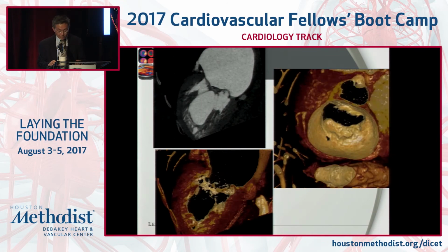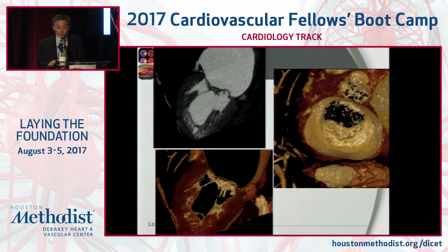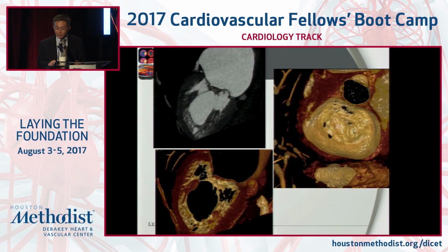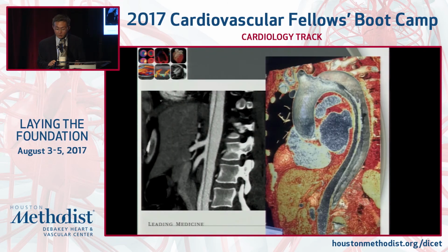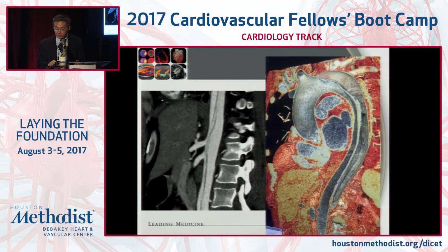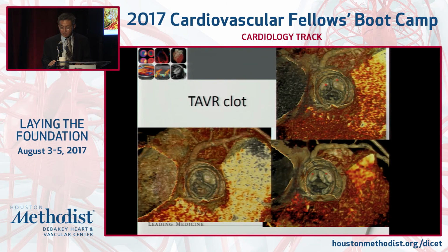It allows you to do 4D imaging, essentially 3D rendered images resolved in time, like this case with a patient with, I'm sorry, let me go back, a patient with mitral valve, in this case a patient with aortic dissection. But the most exciting thing about cardiac CT is the non-coronary application. I'm going to show you some examples of what CT could be done.